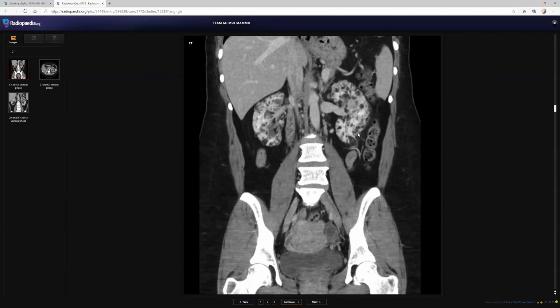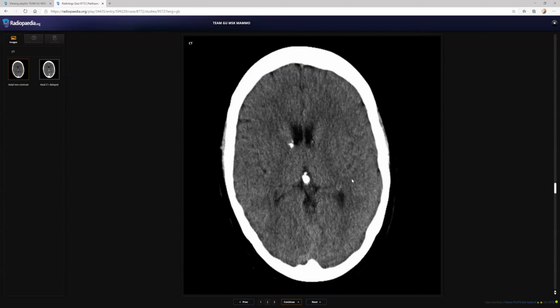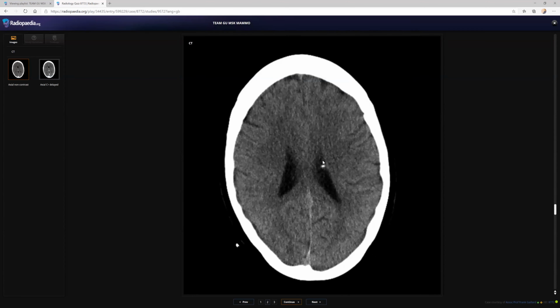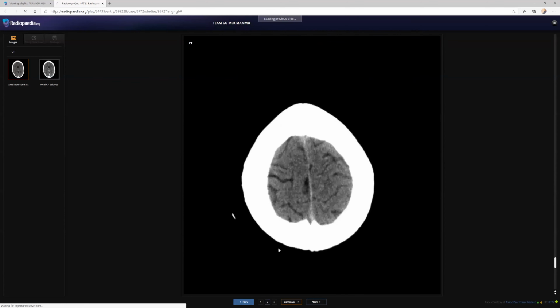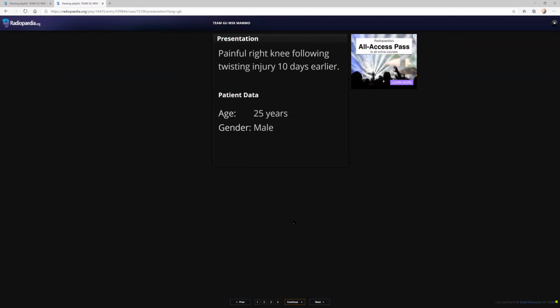And you have to check the previous images and ask for the history, whether this patient has any seizure or any mental retardation. So this patient came with seizure and mental retardation. Then you have to ask for the CT brain, where you can see the calcified subependymal tubers. And you have to say that there is no giant cell astrocytoma now, but you will follow up the case, because any of these lesions can degenerate into a giant cell astrocytoma. You also told you will look at the chest, and since the patient came with seizures, you have to refer this patient to the neurologist, depending upon the history.